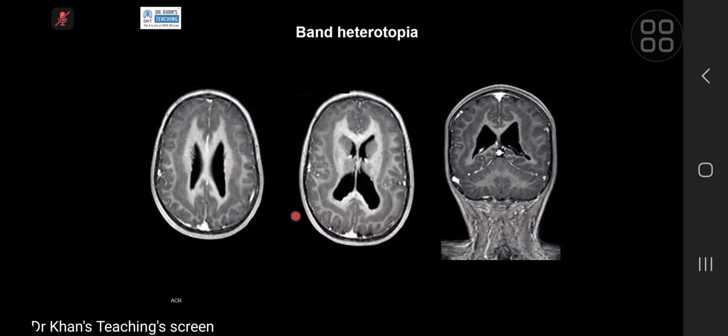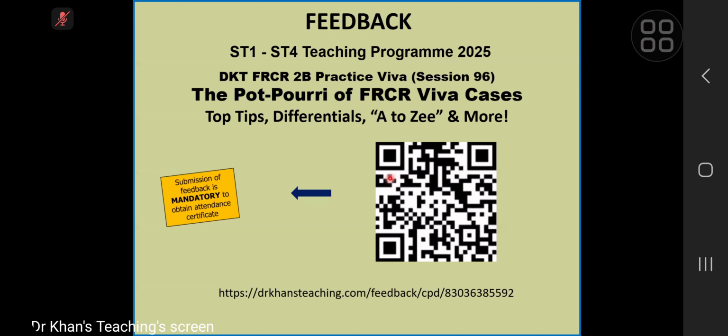This particular case is from the literature, from the American College of Radiology. You can see white matter, ventricle, white matter, then gray matter, then white matter, then gray matter, as if there is a band, a band of heterotopia. I don't think this is an exam case, but I just wanted to show you.